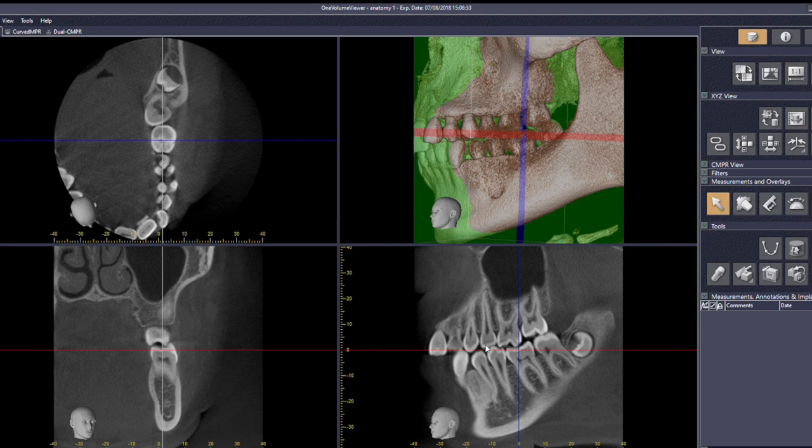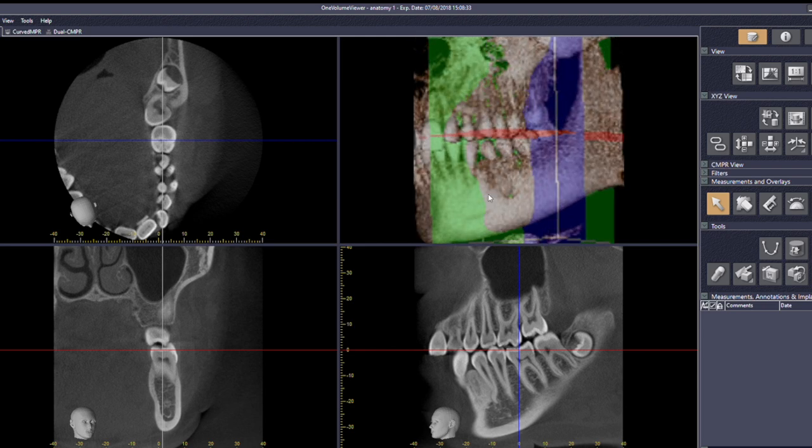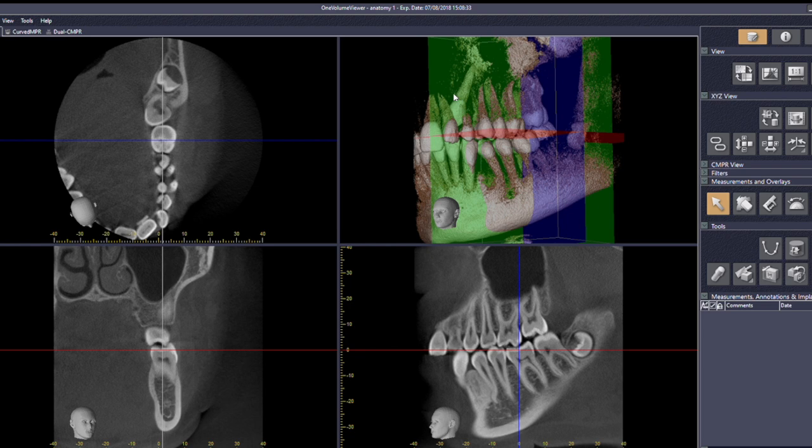We're going to now line up a tooth. The tooth I want us to line up is the ectopic maxillary canine. If we look at the volume render, hopefully you can see we've got a 1, a 2. That's a bit small for a canine. It's actually a C. If I de-render the patient, right click and hold and drag up, there's a 3 that's unerupted.